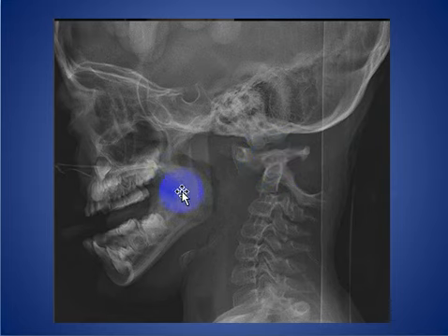And also, incidentally, we have large adenoid and large palatine tonsils in this patient. This is the instability of the atlantoaxial region with accessory os odontoideum.